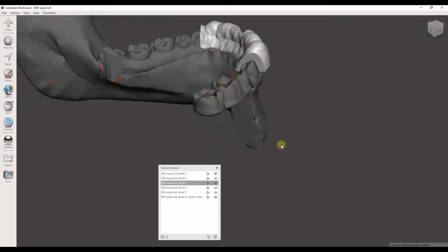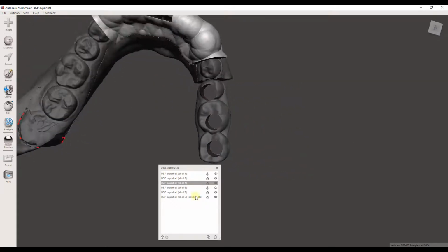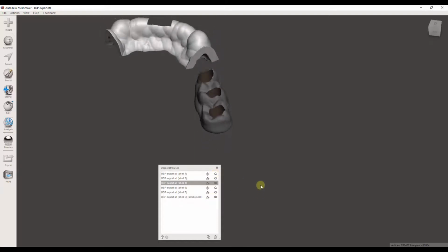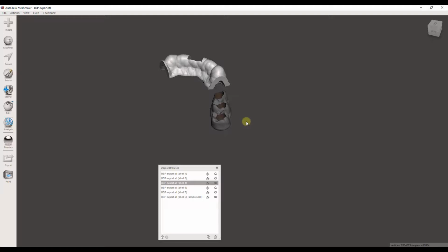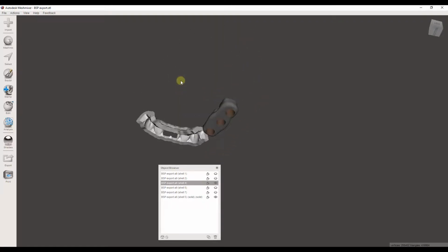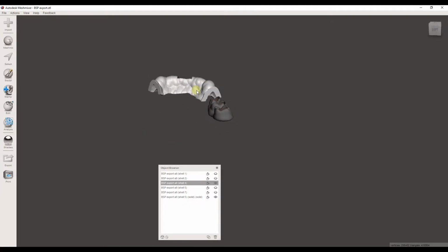Here we go. This guide. And there's different ways you can do this. And I'm going to turn off those other teeth. So we just got these. And so with this guide, we'd like to have an arm that attaches these together.